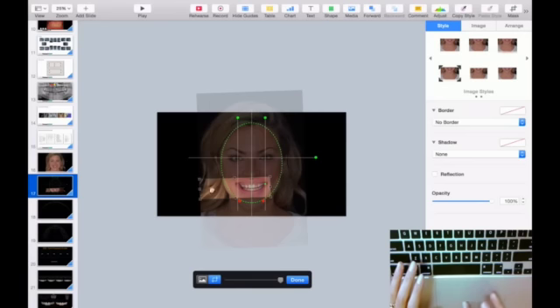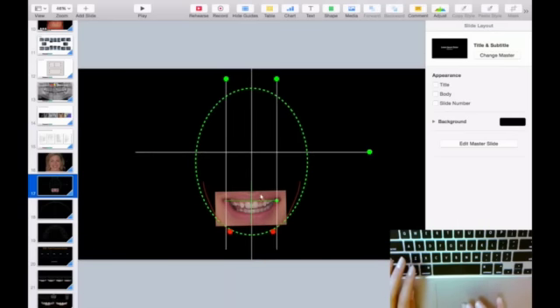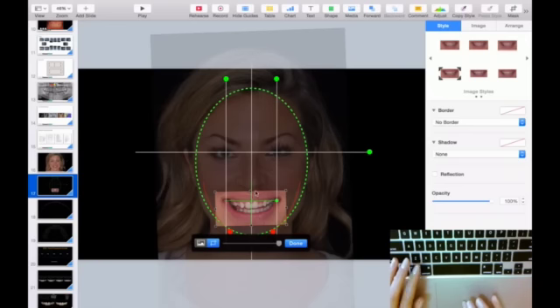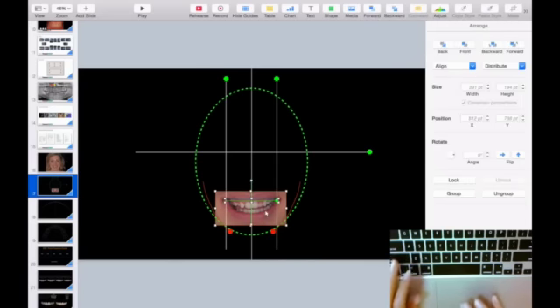And you get only your smile. Now if you don't like the idea that this is a little tilted because we tilted the picture, you can press Command and go on the little square, and your mask will be a little straighter. So then what we're going to need, still crooked, let's fix this, there you go. So now I only need the smile and my cross.